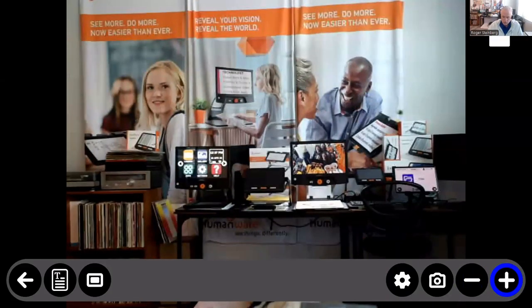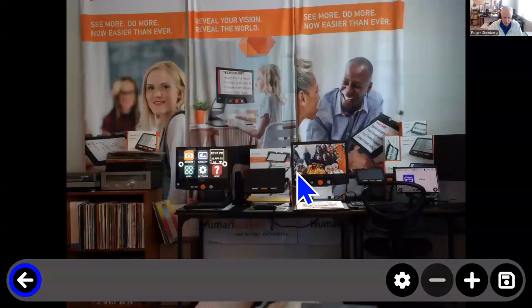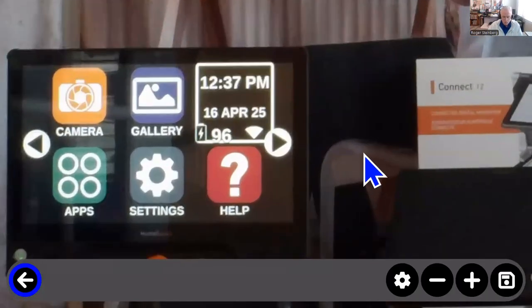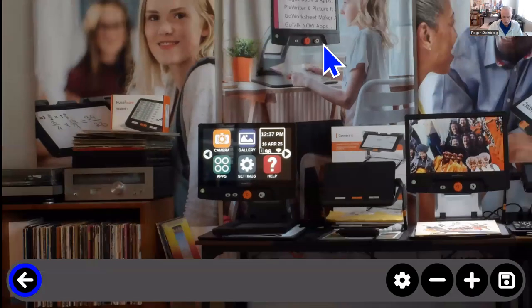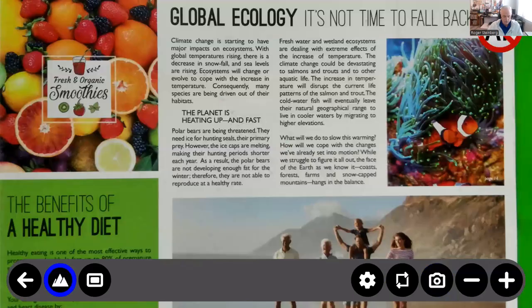Seems to be losing a little bit of clarity going through the zoom here, but we'll go ahead and capture an image so you can see the quality of the camera image you can get out of this. So this is using that camera across a room. It's about 12 foot across, and that's using the Kodak. So that was the IPEVO that I was using for distance there. That setting is very similar for both text and distance camera settings.